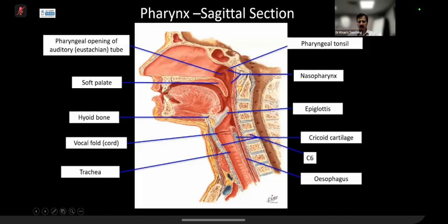And so this is the cricoid cartilage. Posterior to that is the post-cricoid portion of the hypopharynx as well as the esophagus. Radiologically speaking, you cannot discriminate where the hypopharynx has ended and the esophagus has begun. But generally speaking, C6 is the landmark.